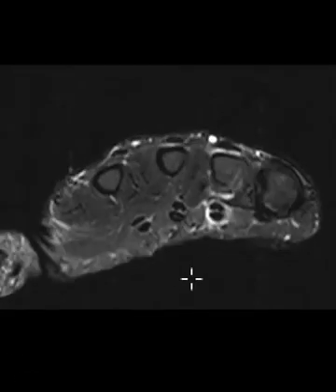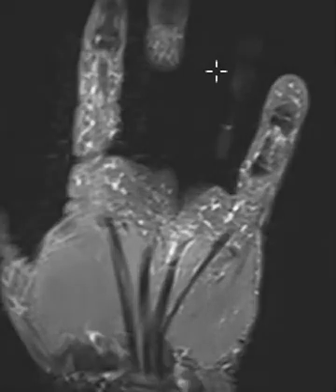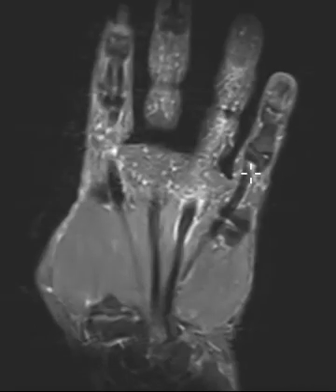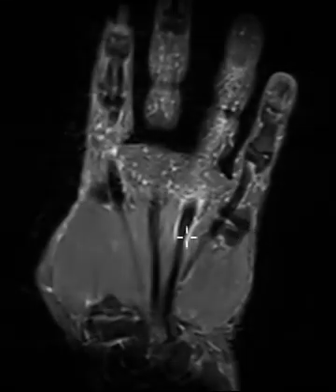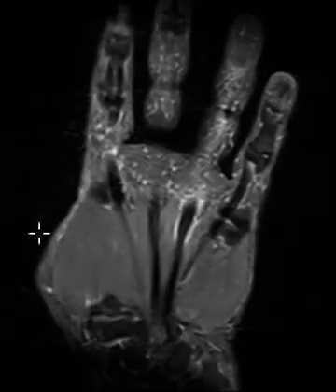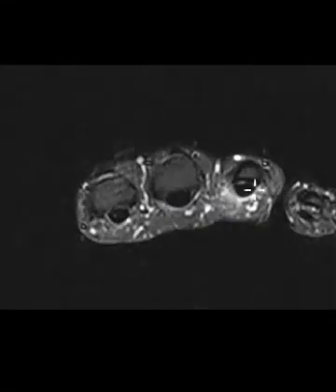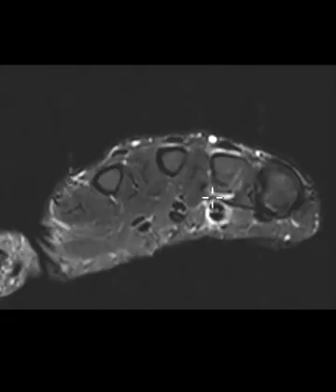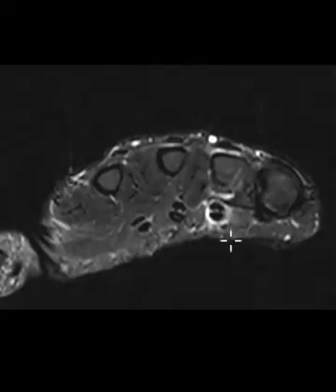We can see this on another view. This is called a coronal STIR view. We can see all the fingers here at the same time. If I zoom back, this is the second, third, fourth, fifth digits. And on this view, we can see the halo of inflammation. That flexor tendon sheath is thickened, inflamed, edematous on that view. So the trigger finger, or stenosing tenosynovitis, is what we call this. And again, this inflammation of that tendon sheath restricts or constricts the flexor tendons. It makes it catch, and sometimes it can lock the finger in flexion.